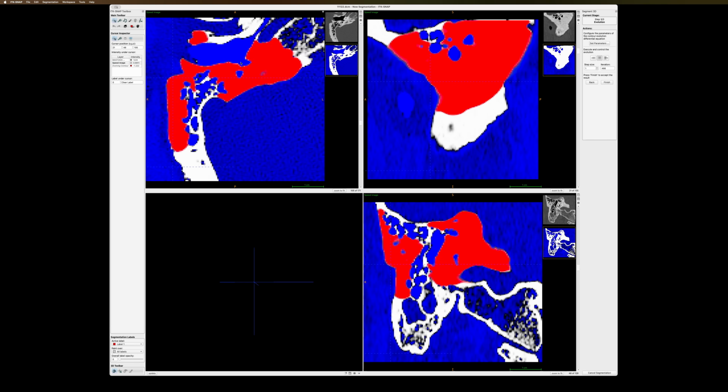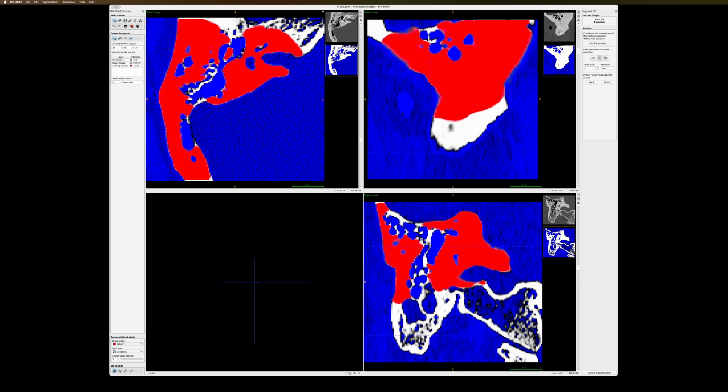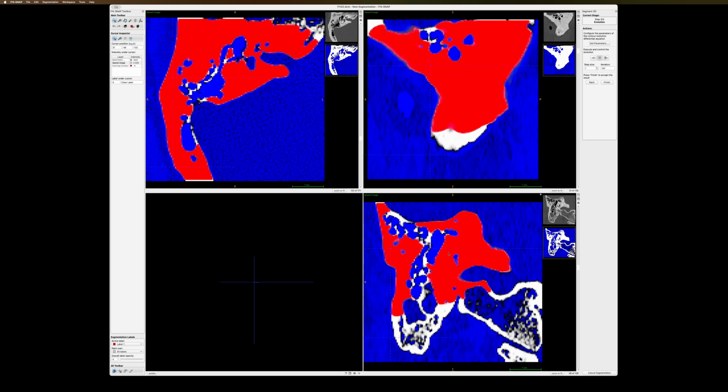So you do have to play with the parameters, smoothing and others, but that's something to discuss in a dedicated tutorial of ITK Snap, which is not the goal of this particular video. It will run the algorithm for a while, and then you just verify. And this is the part I was talking about. This is marrow, it's bone. It looks like you would have some pincer here, but it won't matter because that's not the part you'll be working with.